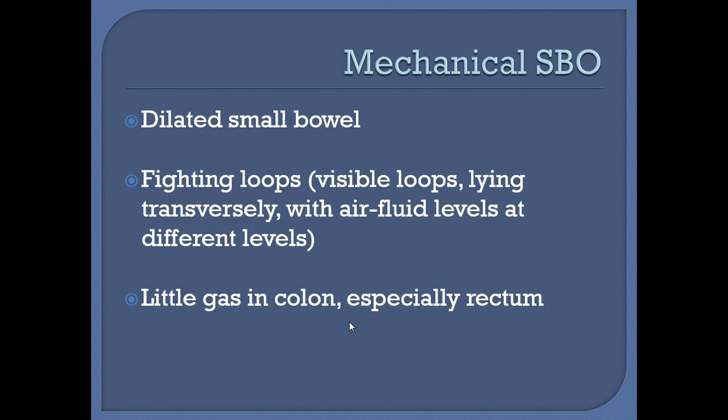Mechanical small bowel obstruction. Dilated small bowel and the fighting loops. What are the fighting loops? These are the visible loops lying transversely with air fluid levels at different levels. There is little gas in the colon, especially the rectum.